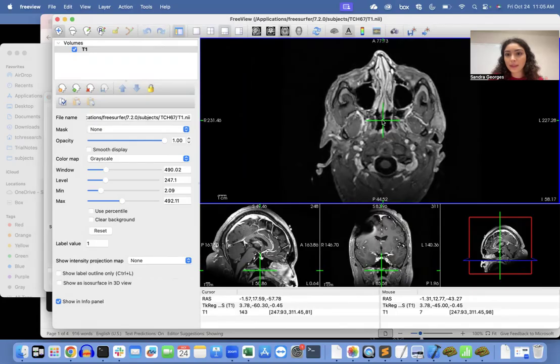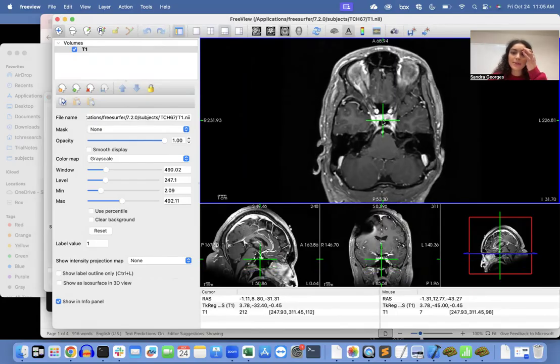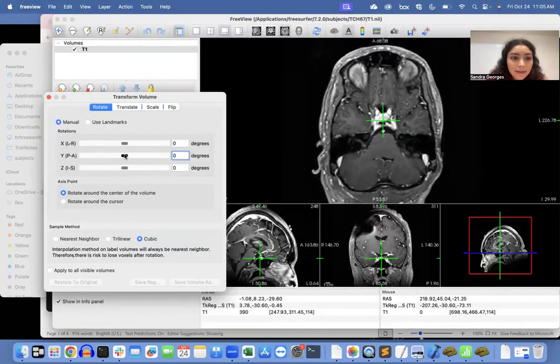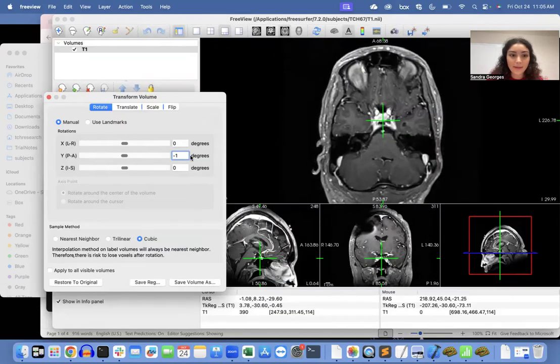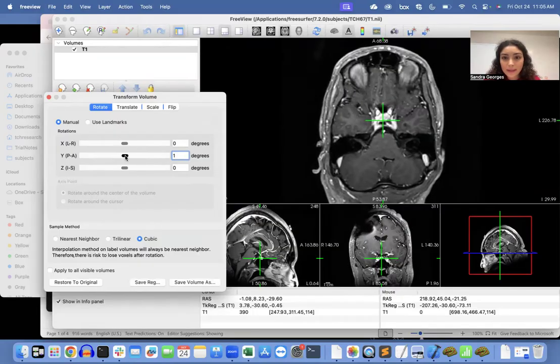So here, when the eyes are first coming in, which is right about here, you can see how it could shift to either side when you manipulate this degree, but I think it doesn't look too far off as it normally is. So that is good.